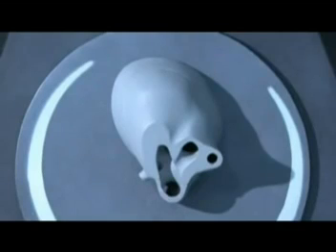Alongside the aortic arch, which is of course now on the right side of the baby, you see the superior vena cava. In the view shown, the baby's lying on its back with the left side on the left, the right side on the right, so the head is out towards us and the feet are into the screen. In this view, it would be quite tricky to see the arches using 2D imaging because they're both running away from us, but you can see the ductal arch here, the aortic arch which has come over the top of the right branch, with the right branch appearing out here, and the superior vena cava here.